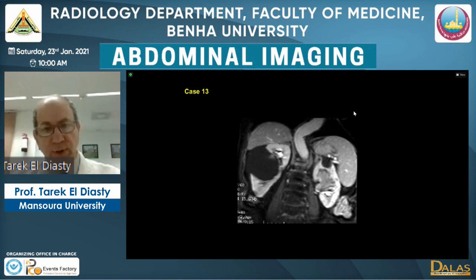In your opinion, what is the cause of such hematuria? It is due to a pelvicalyceal tumor, as evidenced here by enhancement of this soft tissue lesion occupying the pelvicalyceal system. Because it is a T1-weighted image, if the pelvicalyceal system were fluid, it should be black like the simple cyst, but here it enhanced.